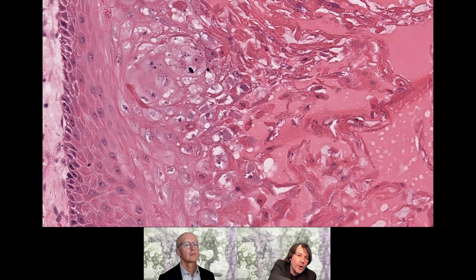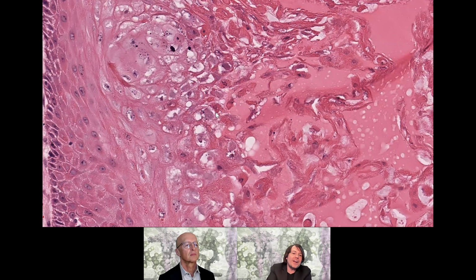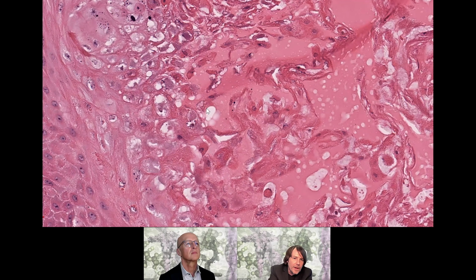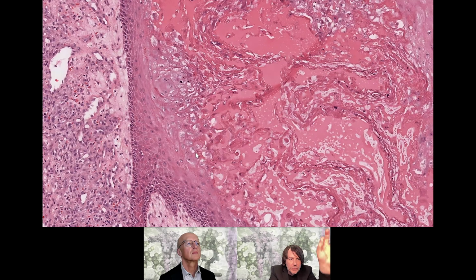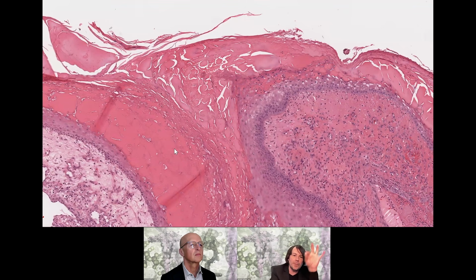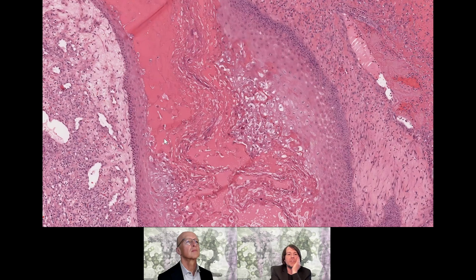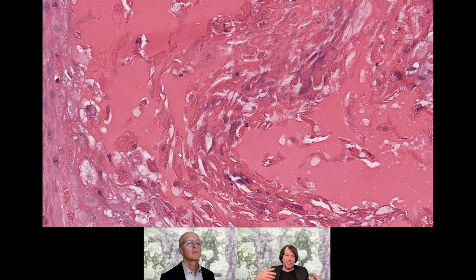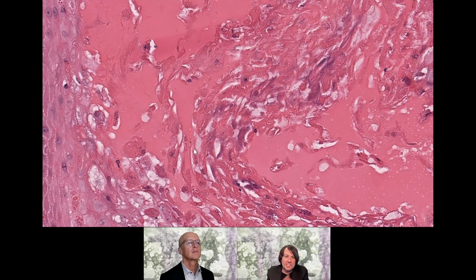So there are some pink blobs there, but I don't know. If you go up just a little bit, Artur, just from where you are, towards the top of your screen, if you just scroll a few keratinocytes higher, or not that much. That same area you were at, just a couple keratinocytes up there, some little globules. The problem is I see lots of little eosinophilic globules in tissue, especially when there's blood, when there's serum.